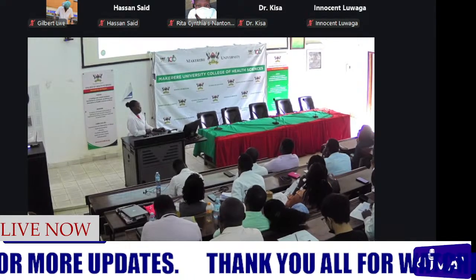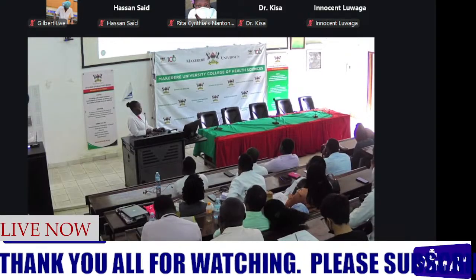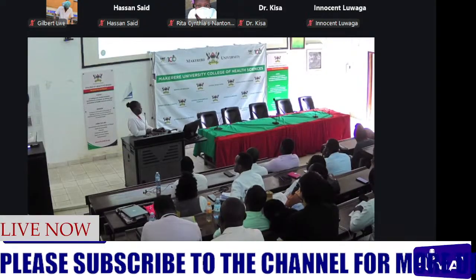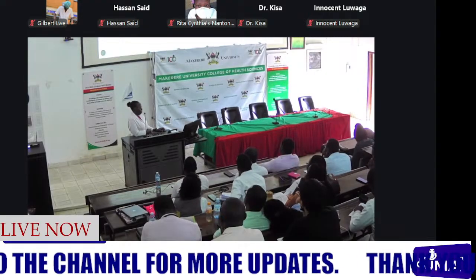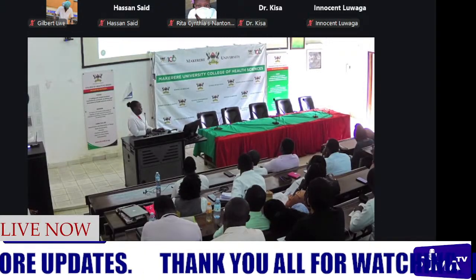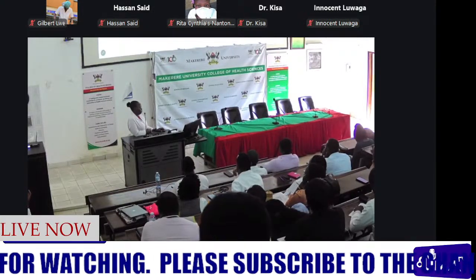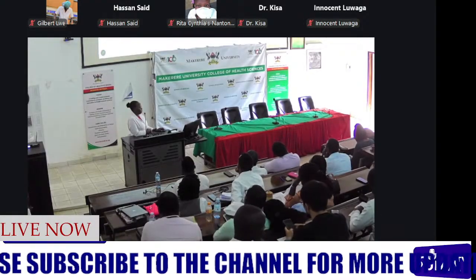So here, in image A, we see a Stanford type A. It involves the ascending aorta and the aortic arch, and it may or may not involve the descending aorta. However, Stanford B is strictly confined to the descending aorta, meaning the dissection should start from a portion distal to the origin of the left subclavian artery. So we have here two images, a CT aortogram at the level of the aortic arch. And for Stanford A, we see the proximal descending thoracic aorta, then the aortic arch, and we see the intimal flap, which is extending all the way to the aortic arch.